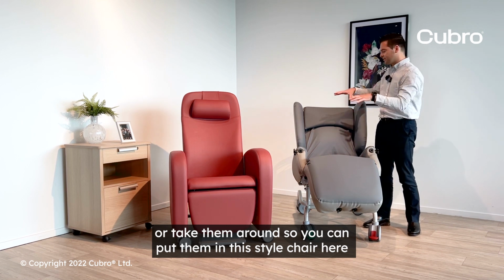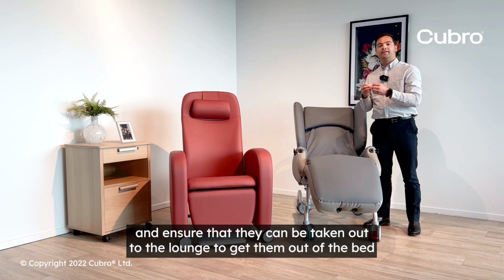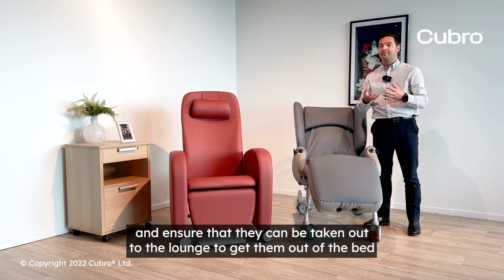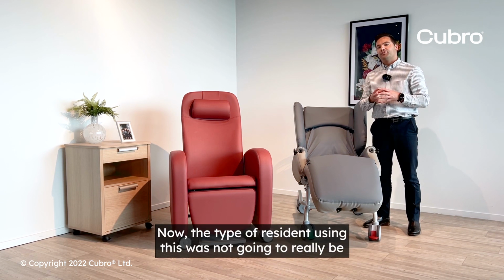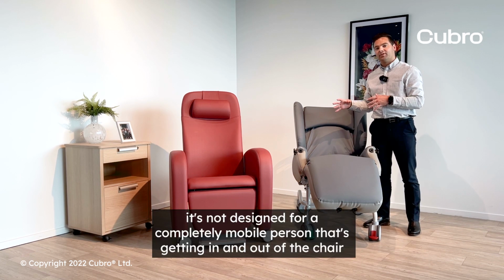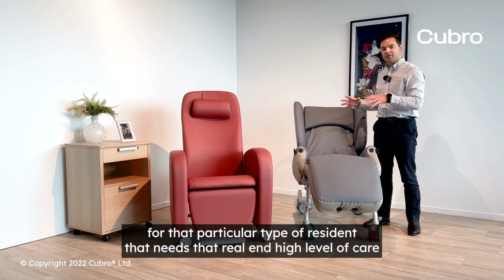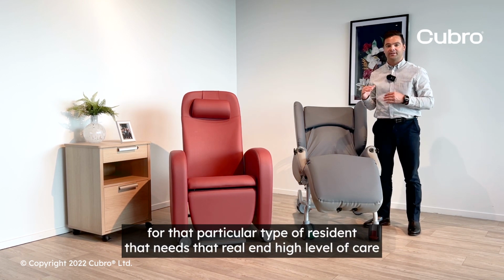So you can put them in this style chair, and it's designed to offer them pressure relief and ensure that they can be taken out to the lounge to get them out of the bed. It's not designed for a completely mobile person that's getting in and out of the chair. It's designed for that particular type of resident that needs that high-end level of care.